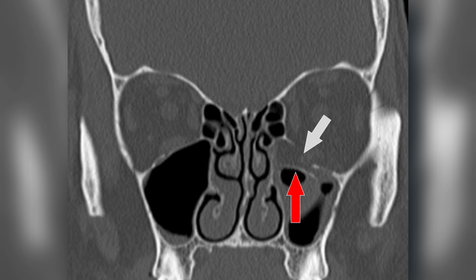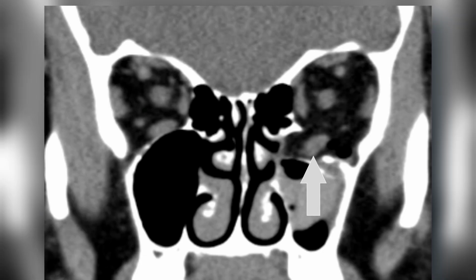the maxillary sinus. Inferior displacement of the inferior rectus muscle, which may be partially or completely prolapsed into the maxillary sinus. The teardrop sign on coronal images, representing herniated orbital fat and muscle hanging through the fractured orbital floor, is a classic indicator. A change in the orientation or contour of the inferior rectus, such as angulation, flattening, or bowing, especially when compared with the contralateral side.